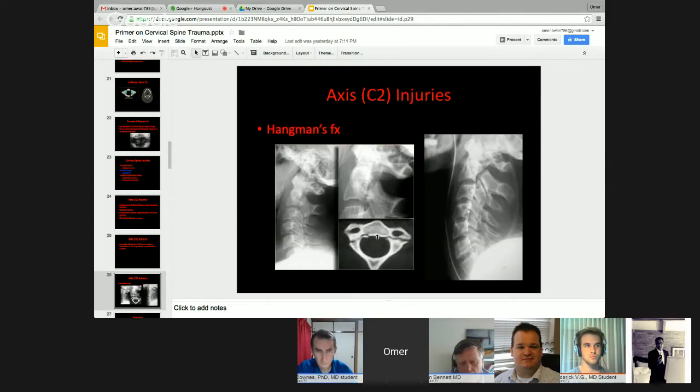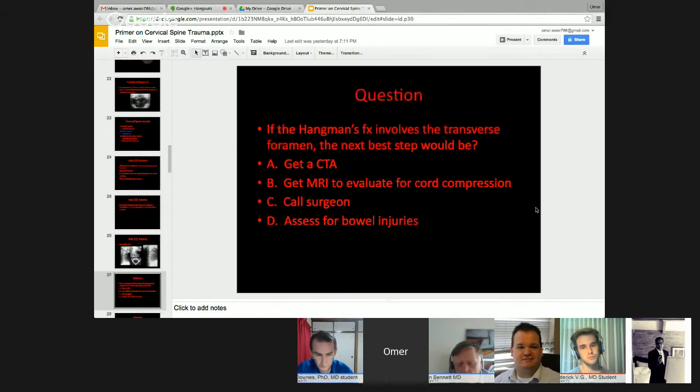You can see on the axial plane there's a fracture plane that goes through the entire pars interarticularis bilaterally. You can see that on the lateral view of the cervical spine. This lucent line here is through the pars interarticularis there. Same here, pars interarticularis. This was actually the first case, I think, that I showed on my pre-quiz assessment. So this is a hangman's fracture or a C2 fracture, okay? Hyperextension with axial loading, classically stable, okay?